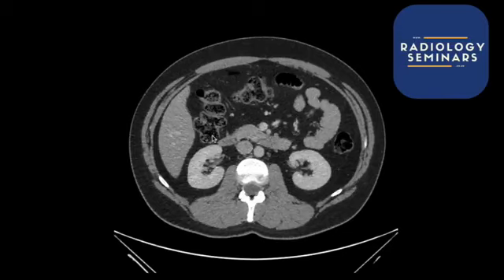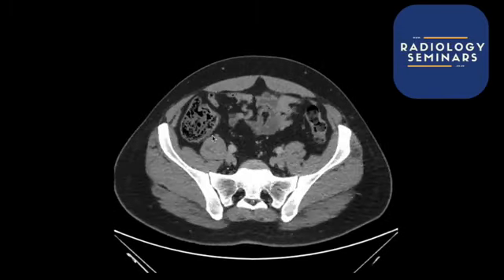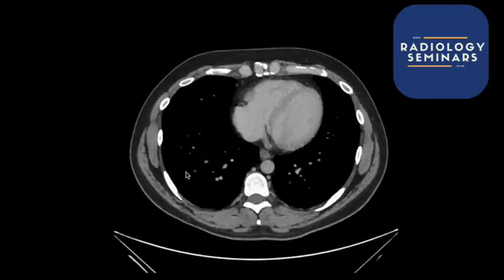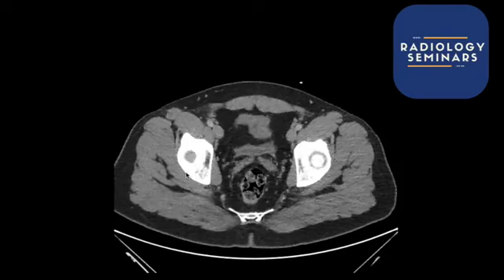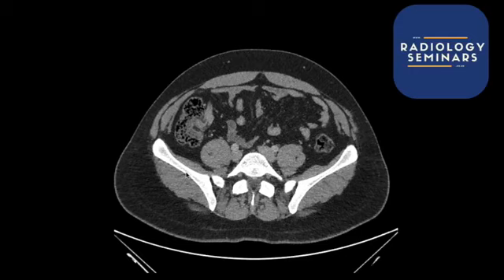So this is what I mean. You start from the top all the way down to the bottom. It doesn't matter whether you pick anything up, or you're seeing anything abnormal. Just go for it all the way to the bottom, right? So we've gone to the very bottom of the scan, and sometimes that's a really good thing to do, just so you get a flavor of what's going on in the scan. And as you get better and better, things that are abnormal will really just pop at you. They just jump at you like, oh, that's something that's not quite normal.